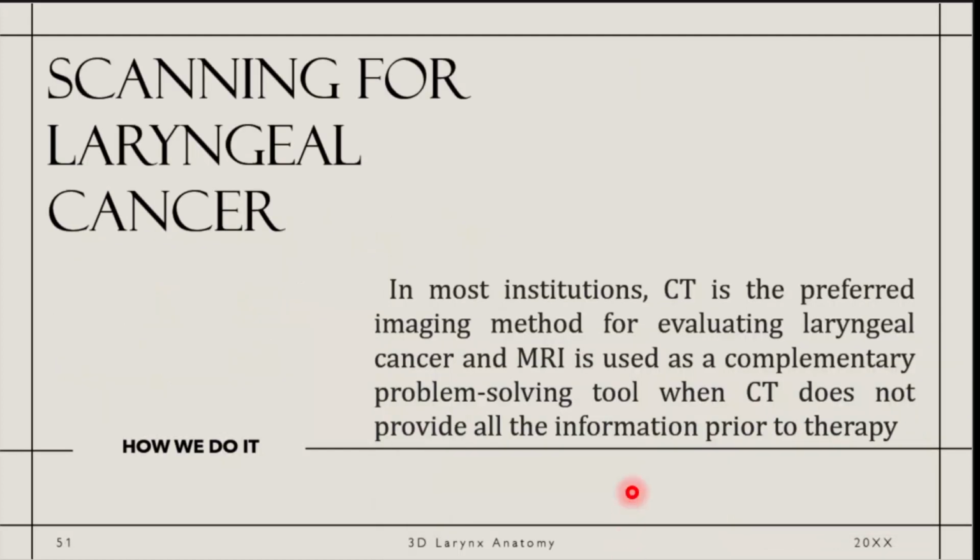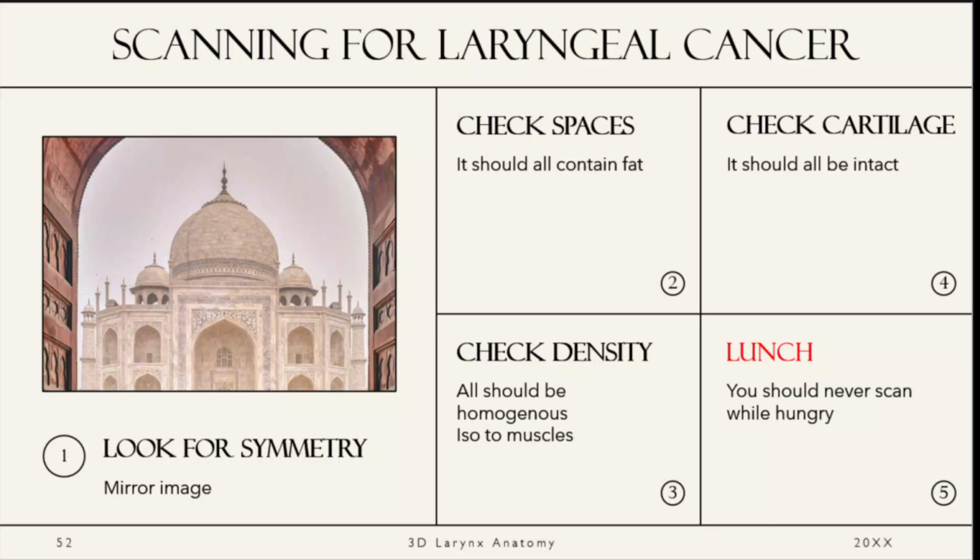Okay, in most institutions, CT is the preferred imaging method for evaluation of laryngeal cancer. As we said, the MRI is used as a complementary problem-solving tool when the CT does not provide all the information prior to therapy. So I'll try to show you how we radiologists think.